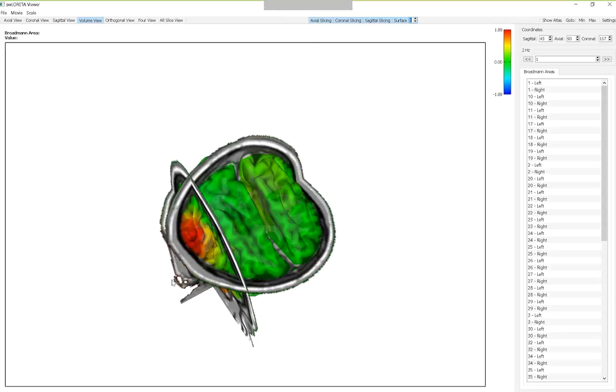This is a three-dimensional view. It's just one of the views that are in the viewer. Up here, there's the ability to control and look at axial, coronal, and sagittal slices, all three at the same time, plus the three-dimensional volume, and also 4-view versus 3-view, like the Key Institute, and all slices as well. And there are coordinates that you can use to see which slice it is.